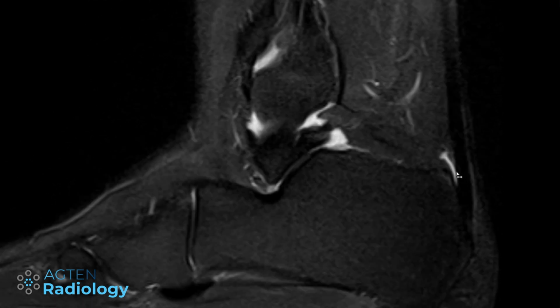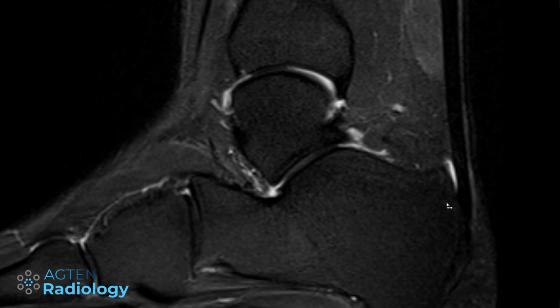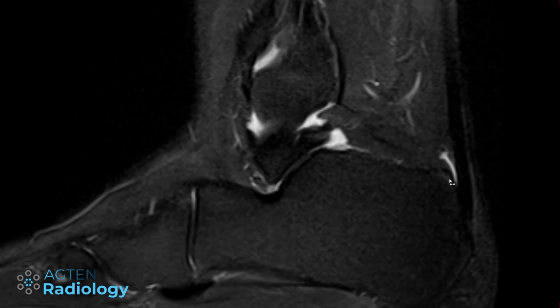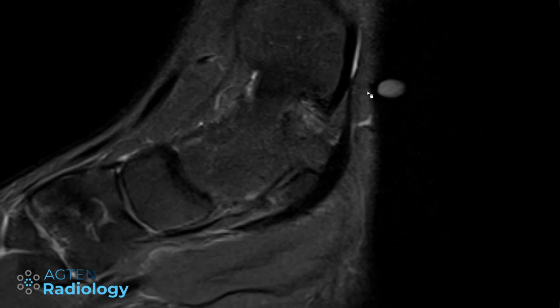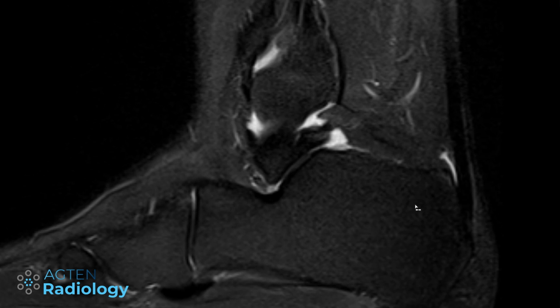And together with all this, with the just a little bit over our limits amount of fluid, bone marrow edema, and this subcutaneous or paratenonitis here, we can say this is abnormal and potentially a very subtle bursitis. Now the patient has pain up here just behind the medial malleolus, so we are not really having the issue here. And this is probably sometimes the case where patients have a lot of friction and stress here, but not on a level that bothers them or that is even clinically manifesting itself. But it's just like a subclinical bursitis. So that might be a term we could use in something like that.